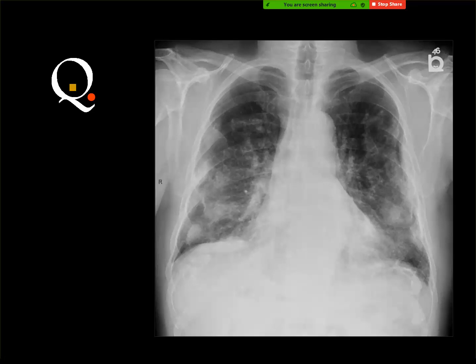Bilateral dense opacity, yeah, with the pleural irregularity, yeah. Most likely pleural plaques. Very good. And this is the right answer. And you see, as you have said, and also I have mentioned this many times before, if you see bizarre shaped opacities in the lungs and you cannot specify the origin of these lesions, please look to the diaphragm.